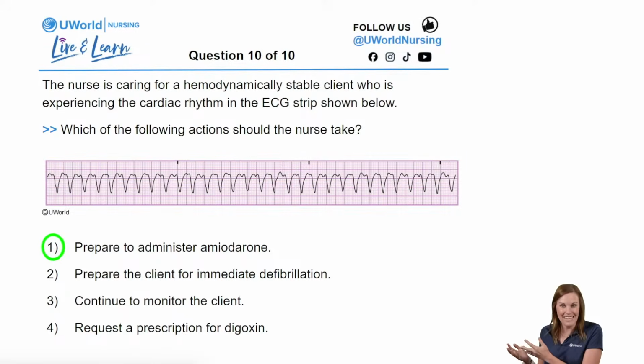Let us know how you did out of the 10 questions. This was awesome. I saw a question here. How do you know it's stable? In this question we said they're stable, so you kind of have to put some of the clues together of what the question is saying and also what you're seeing in the strip. So good job, you guys.